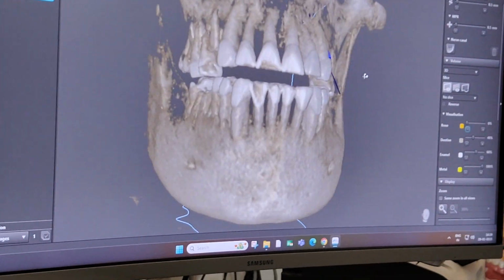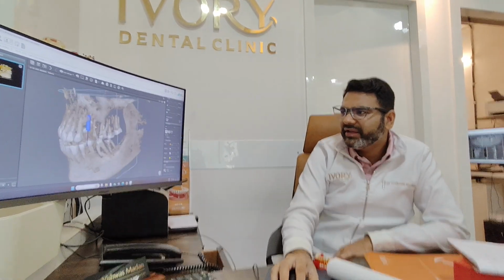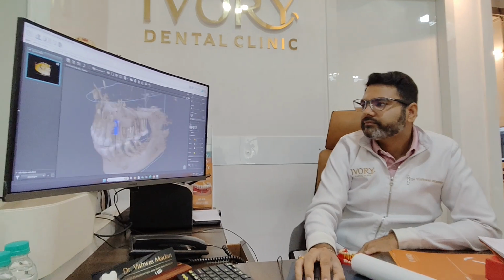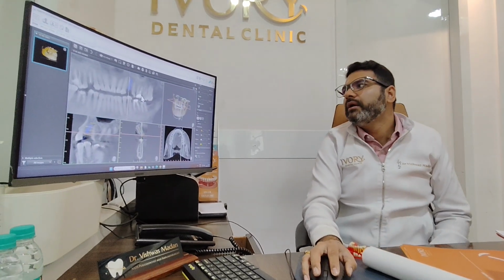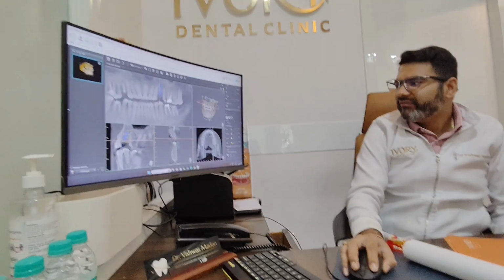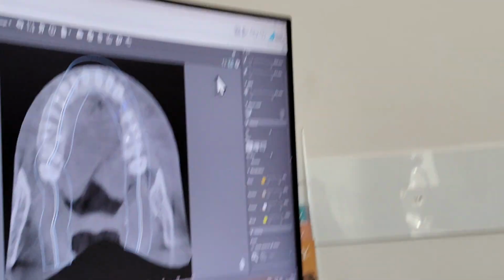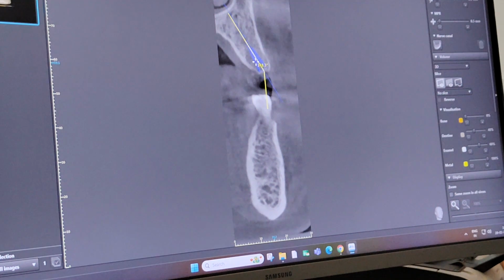We have to position it according to the bone, or the future tooth which is there. So here we have enough. So implants we have to place according to the bone that is there, and then we choose the abutments. No. Most of that prosthetically होना चाहिए, but see, we have a lot of bone here and we have good intra space.